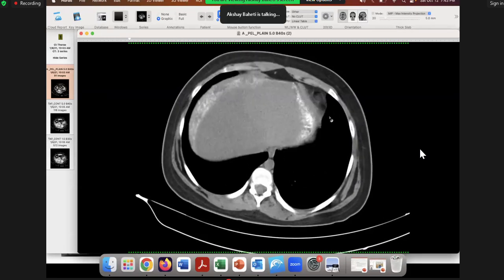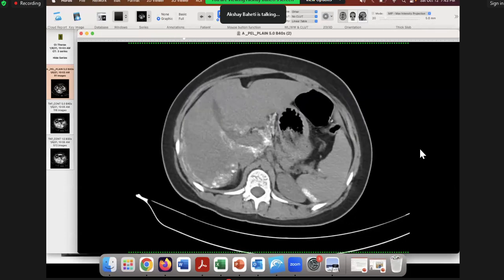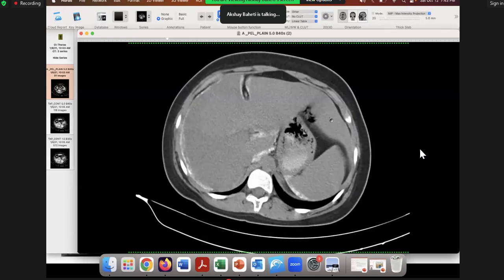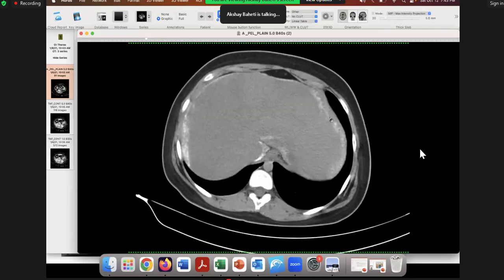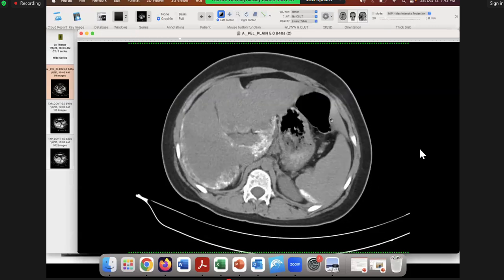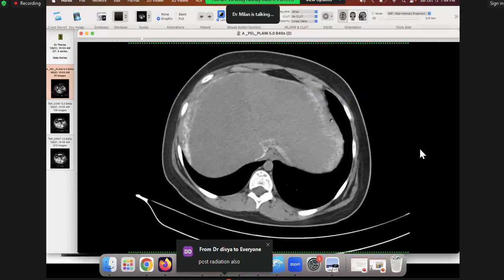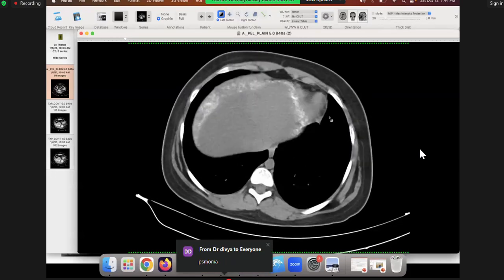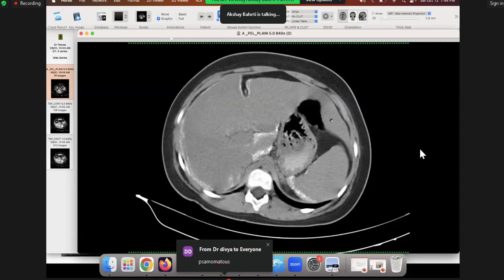Yes. So you see a patient with ovarian cancer with otherwise classic deposits in the sense you see perihepatic, perisplenic deposits, but they are quite calcific, aren't they? You generally don't see so much calcification. So when you see so much calcification, do you know what the diagnosis is? It is ovarian cancer, but it's a specific subtype of ovarian cancer. So mucinous? No, no, not mucinous. Mucinous may calcify to some extent, but it won't be so diffuse. Mucinous can have some foci of dystrophic or punctate calcification, not something so diffuse and sheet-like.